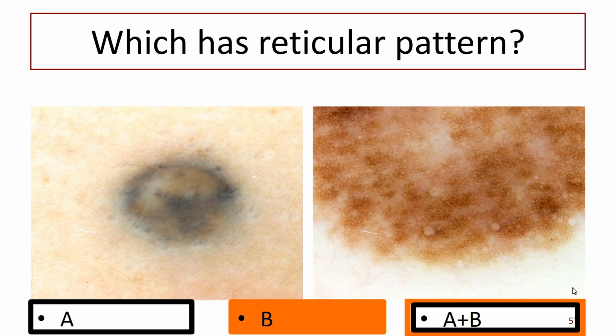You mean you're talking about this? The brown bits are all intersecting lines. Emily's drawn intersecting lines here. Maybe you need to come closer. It's a bit like the vase and the faces. When you're first starting, you're very inclined to see the holes. But actually the holes are the absence of pigment, and they're not the structure of the lesion. They're the background. And it's the pigment that we need to consider as being our structure. So thank you for drawing that to everybody's attention, because half of them were thinking, I see dots.